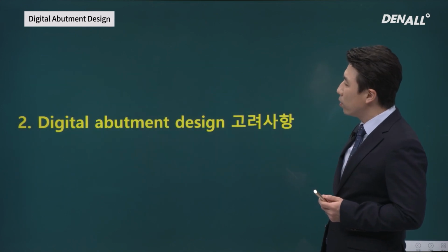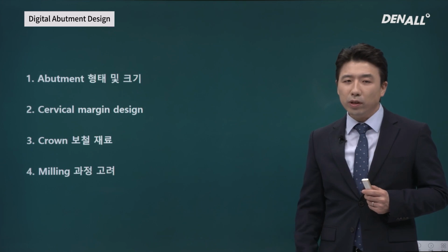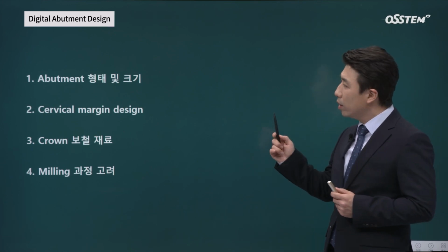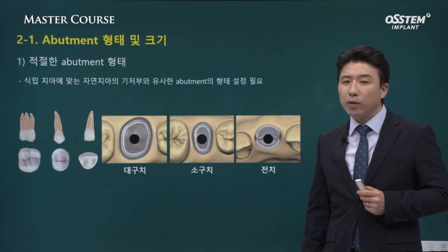I want to talk about considerations that we need to bear in mind upon designing. First is the contour and size of the abutment. I've talked about the contour and shape from the beginning.